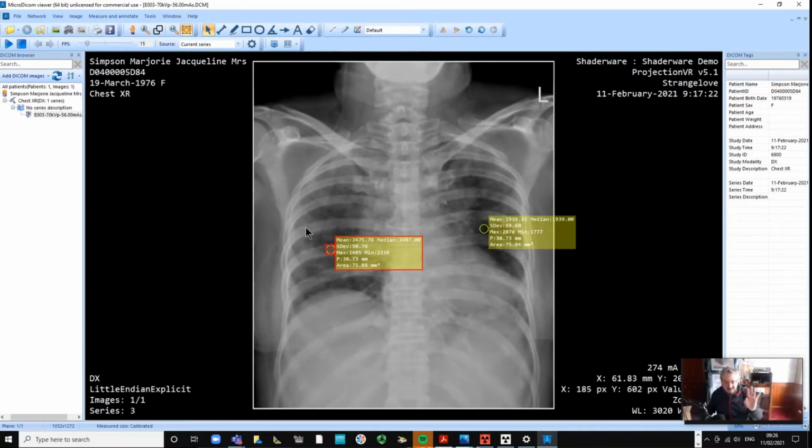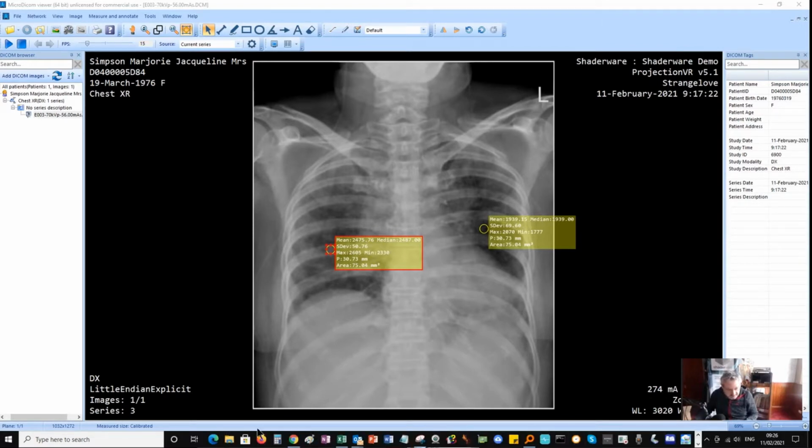The other thing that we need is we probably need to print. I'm going to press the print screen button because what we want to do is capture this. We might use this as a figure in our poster. You've got to be thinking about how your poster's going to look. So I'll print screen that, and we'll save that.